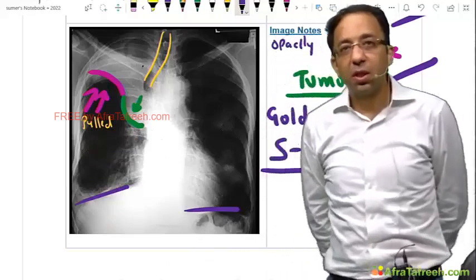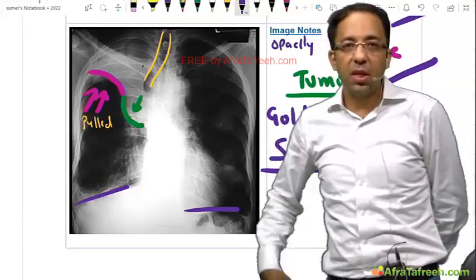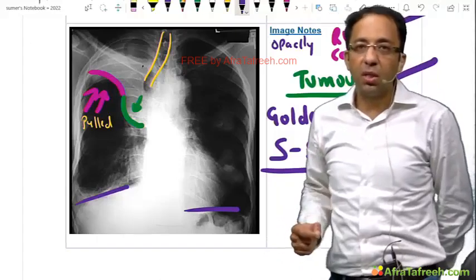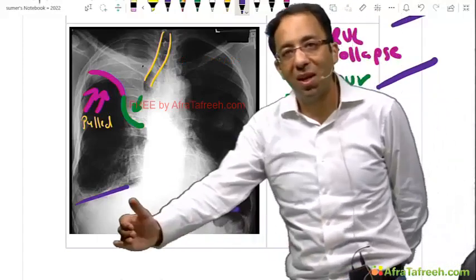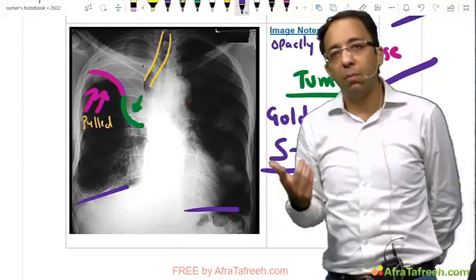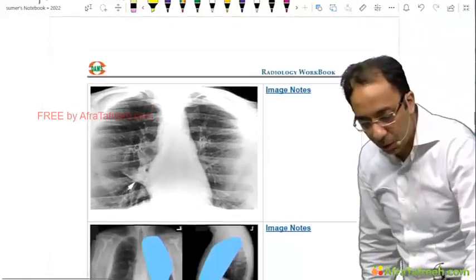It's interesting actually how much we can see on an image, and that is what makes the science of radiology interesting. We have to think. The important criteria that I want you to understand is the difference between a good doctor and an average doctor: good doctors are thinking, and an average doctor is using memory. You cannot remember everything, but if you're thinking, you will always win. Okay, so this is a smoker with a bronchogenic tumor with emphysema. Interesting. Let's go forward.